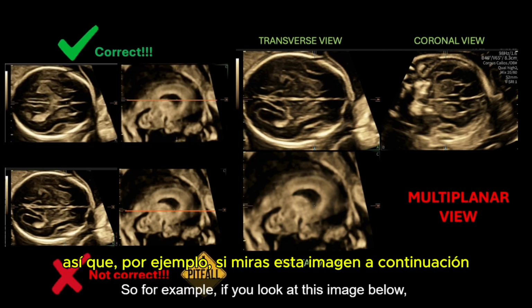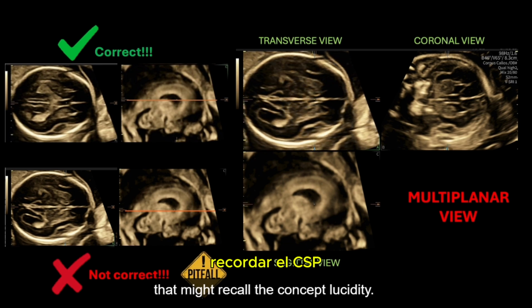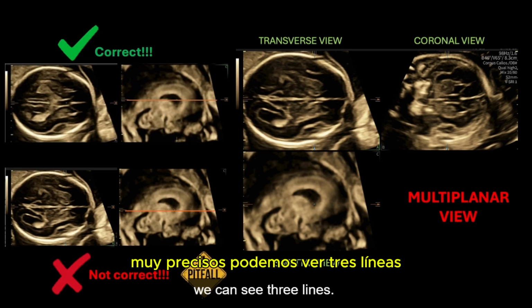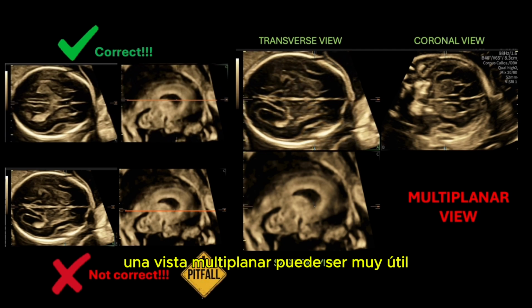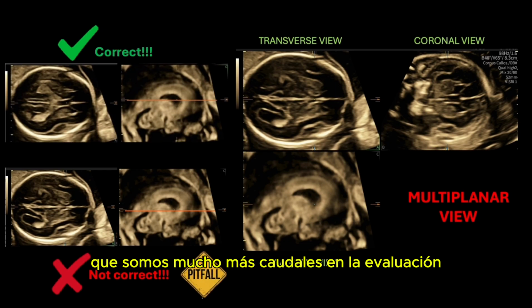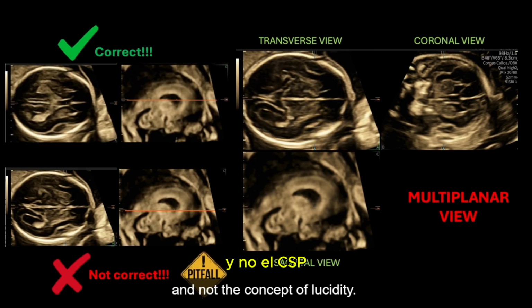For example, if you look at this image below, you can see something that might recall the cavum septum pellucidi, but to be very precise, we can see 3 lines, and in these cases a multiplanar view can be very helpful, because we can see that we are much more caudal in the assessment, and what we are assessing is the fornices and not the cavum septum pellucidi.